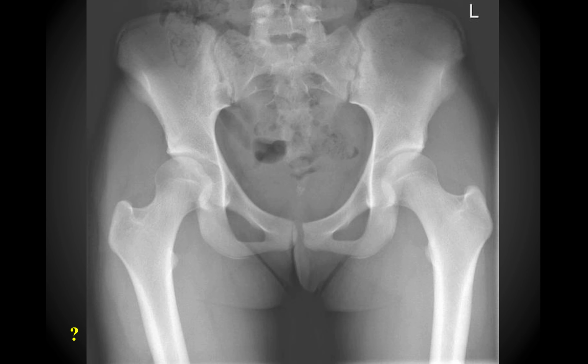All right, so here we have another pelvic scan. And on this one, again, you can see where it can be easy to miss things on a pelvic scan. So if you do your normal survey of the bony structures and you look at the pelvic viscera as well, you don't notice anything abnormal in this patient unless you look up along the iliac crest. You don't want to forget to also look at the ilium when you're looking at a pelvic scan.